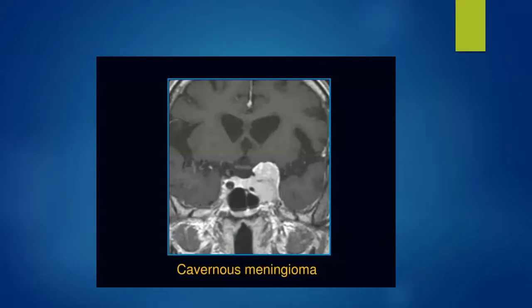Dural tail. Very good, excellent, very good. So there's a little dural tail extending laterally.